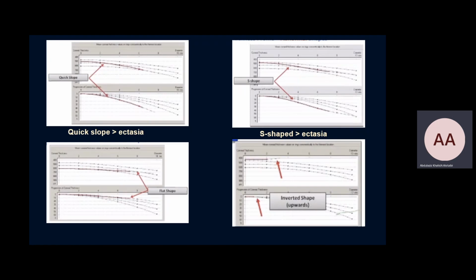What about number 2, the one in the upper row? What does this shape mean? What do you think?